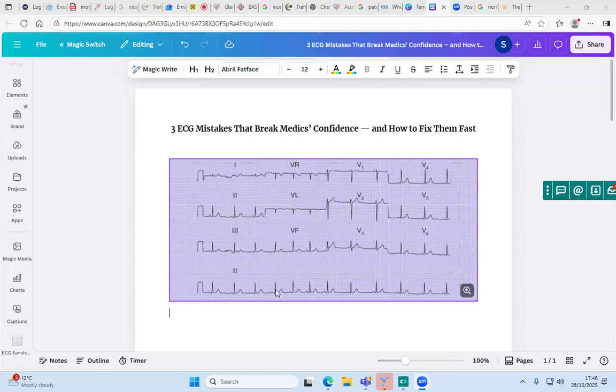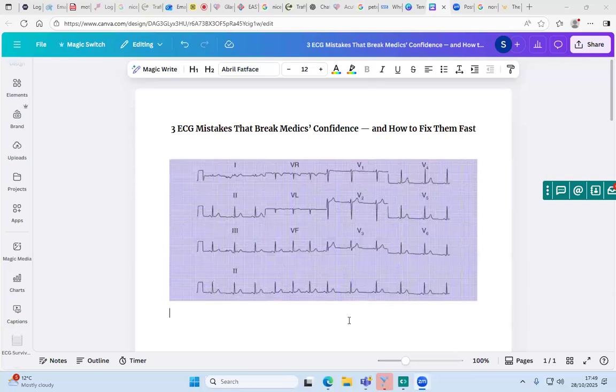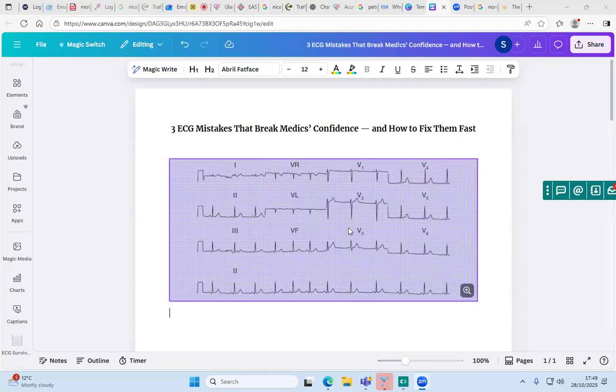And for that, I do 2, 3, aVF. I use the 5-zone method. So 2, 3, aVF will form a zone, right? Then V1 to V4 is another zone. 1 and aVL would be another zone, and V5 and V6, right? And then I look across all of that, and I do not find an ST segment elevation. If you're confused about V1, V2, V3, do draw a line from your P wave here to your Q, to the J point where the ST segment starts, and it falls on the same line here. So we don't have a problem.